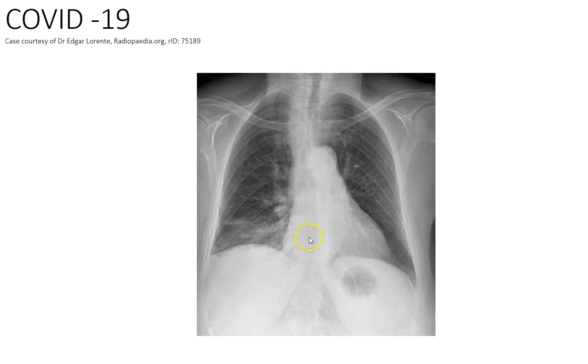They're saying, so this patient has a nice, again, nice and straight and central, the clavicular heads. Perhaps they were a little bit rotated when they took this film. Counting the ribs down, 1, 2, 3, 4, 5, 6. So maybe not a full inspiratory film. Or maybe a slightly raised hemidiaphragm on the right. And that kind of fits with some of the other features that we're seeing.